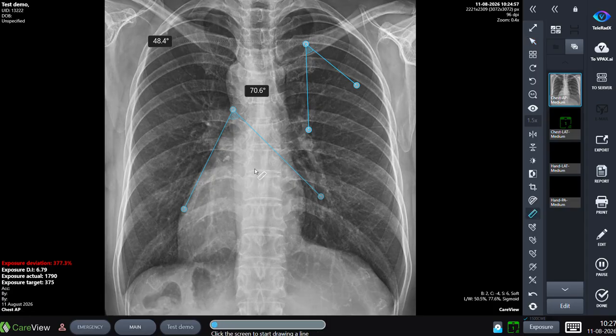With this tool, you can measure the length. And again, you can move the annotation to wherever you want. This is the right label. This is the left label. And here you have some free text that you can place on the image.